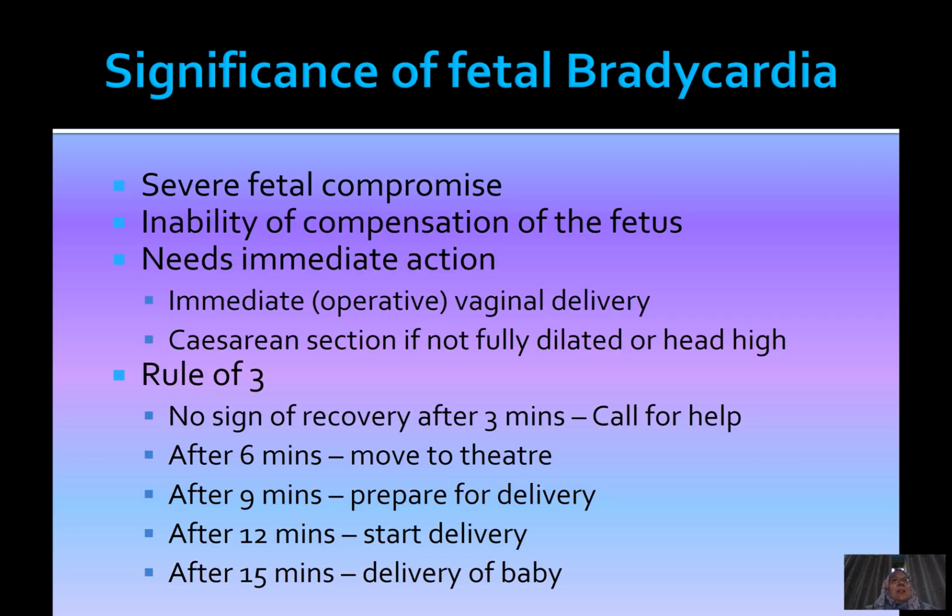So what is the significance of fetal bradycardia? I have also already mentioned it very briefly in a previous CTG. Fetal bradycardia is the expression of severe fetal compromise. So the baby experiences a sharp drop in the baseline rate and cannot rally from this. The fetal reserve is compromised in such a way that they cannot on their own recover from this fetal compromise. So it's an inability of compensation by the fetus, and it needs immediate action.